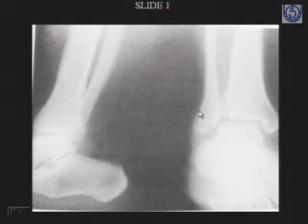On these conventional skiagrams, we are seeing that the joint cavity has been maintained in the ankle joint. The distance between the lower part of the tibia and the dome of the talus has been maintained. Also, the distance in the tibiofibular joint cavity has been maintained. If we look at the upper part of the skiagram, where the tibia, fibula and surrounding area are, we are seeing some soft tissue densities, added densities in the calf region.